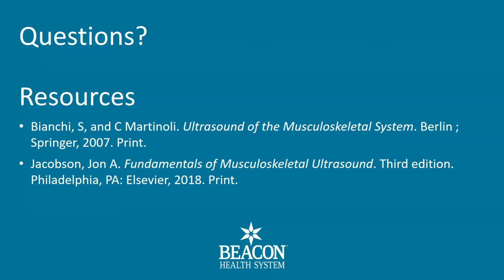Speaking of that, enlarged fat pad, this is in the we-see-it category, but there is an article or two on it where there's just subcutaneous fat hypertrophy. In other words, the layer is thicker. The medial elbow, volar forearm, medial knee, and medial ankle would be the most common areas I see, where you basically see normal subcutaneous adipose tissue, but it's thicker than the contralateral side. And I agree, I've seen a few cases right over the Pes.